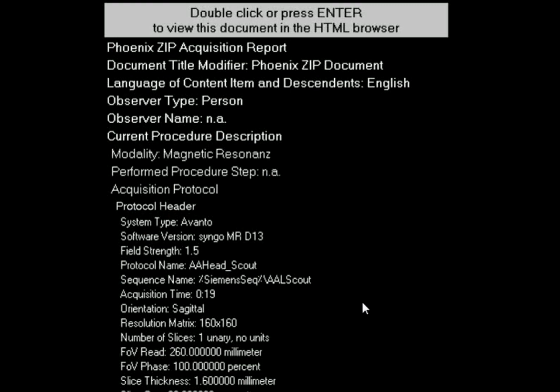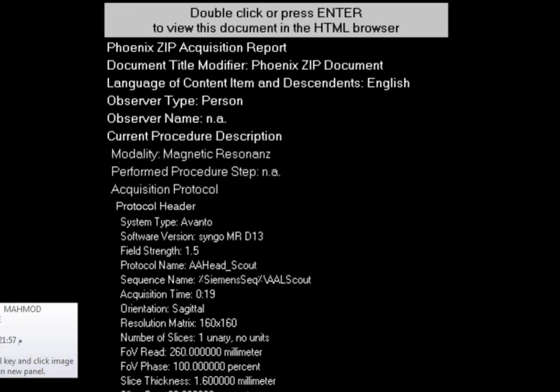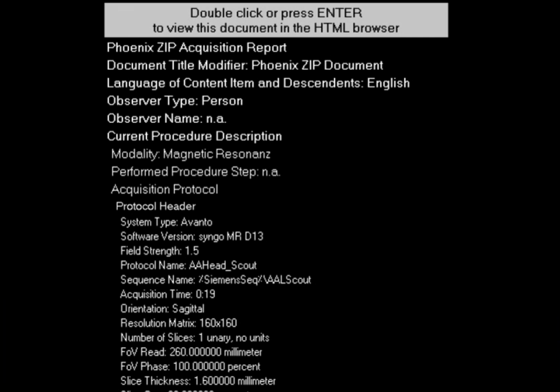Everyone, today we'll start with our first case. As you requested, we'll start simple with a 99-year-old patient. He's presented with acute disorientation. On his MRI, you'll see a lot of motion artifacts because he's drowsy, disoriented, not very alert.